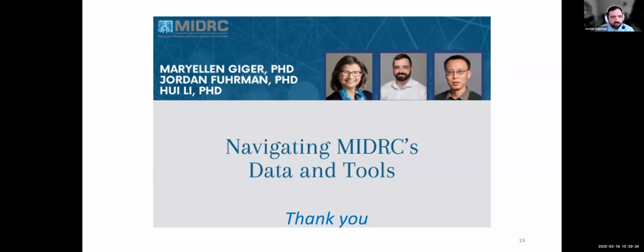You could download, for example, from the data.midrc.org website, a table that gives all of the metadata characteristics and such. And you can use that, for example, the React tool and the stratified sampling tool can both take that table as input, and you can do evaluations on that. For all of these tools, you're not uploading anything. For the React tool and stratified sampling tool, they're run locally.